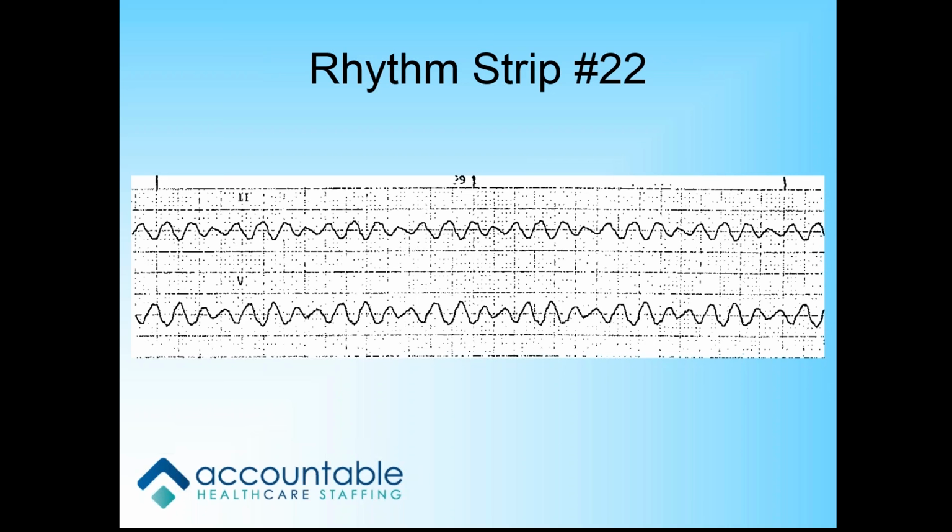Don't like this one. What is it? VFib? Exactly. This is VFib. You need to know this rhythm. What are you going to do for VFib?